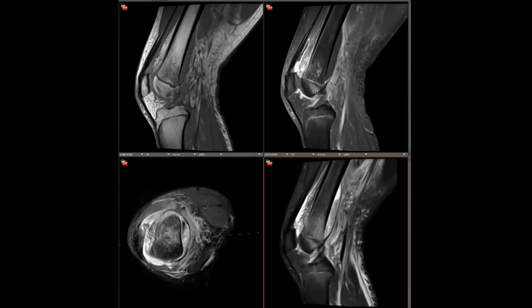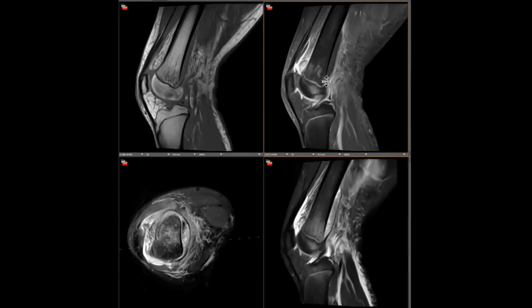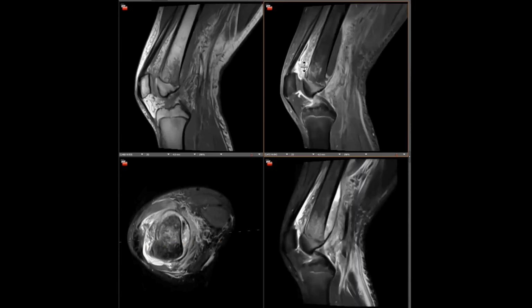As the osteomyelitis progresses, the disease process can decompress through an adjacent metaphyseal cortex. If the metaphyseal cortex is extra-articular, then a subperiosteal abscess can develop. If the metaphyseal cortex is intra-articular, then a septic arthritis can develop. In this particular case, the posterior cortex of the distal femoral metaphysis is outside the joint capsule. Hence, we have a subperiosteal abscess. Anteriorly, the metaphyseal cortex is within the joint capsule, resulting in septic arthritis.